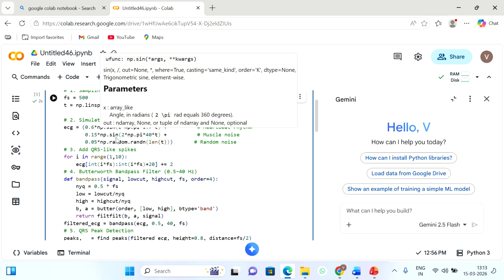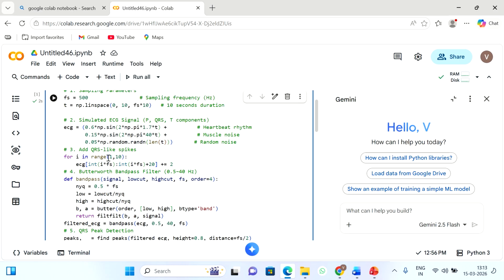in between two R's, there will be grid paper only. Small squares and large squares will be there. So heart rate will be found by counting the number of large squares between two R's. The formula is 300 divided by the number of large squares between two R's. That is why the R peak is still exaggerated, to get the sudden sharp peaks.